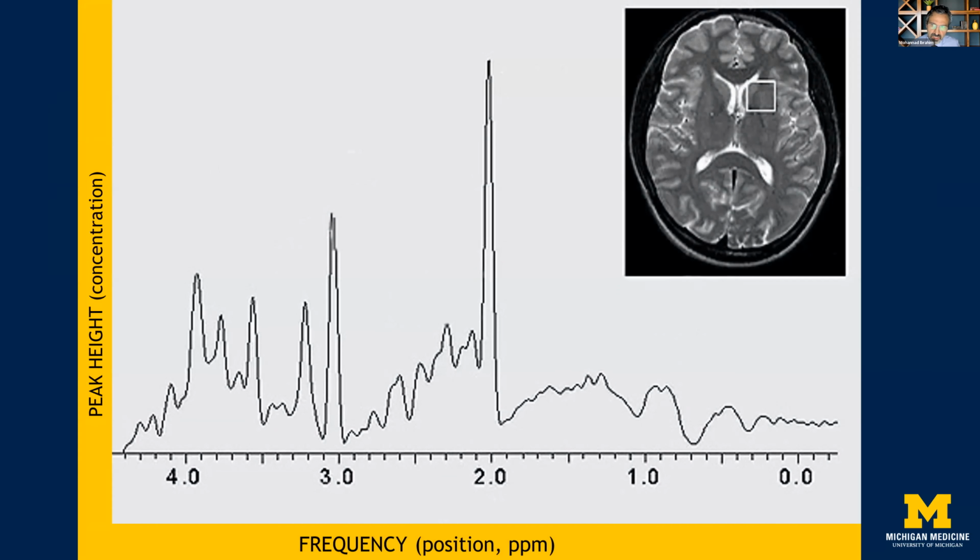I just put this slide to explain a little bit of the MR spectroscopy and how it's read. This is just a very short look into it. Clearly, there are a lot of references in the literature on how to read the MR spectroscopy.